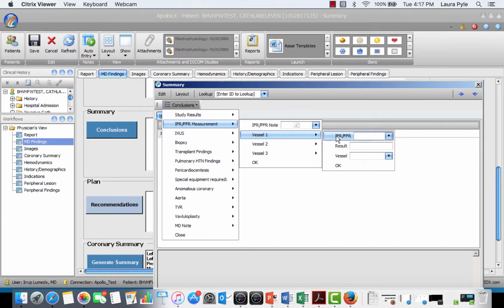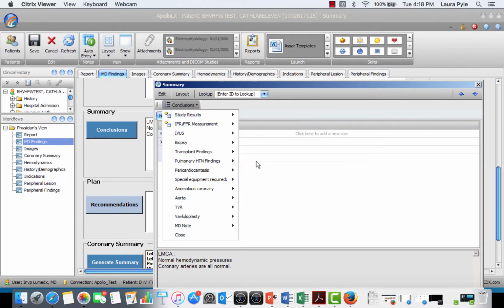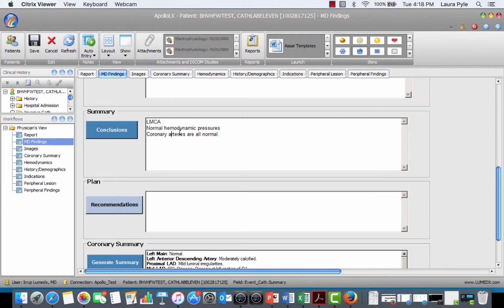Smart Notes allow you to quickly enter data into a memo field while still allowing you the flexibility to include certain record-specific notes, as I demonstrate using a couple of the Smart Notes that are pre-built. If you prefer, you can type directly into the summary box.